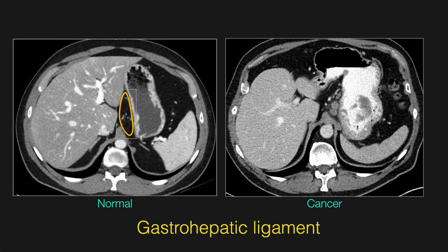When you're concerned about gastric adenocarcinoma, often you don't have to look much farther than the gastrohepatic ligament for clues. Normally, there is just fat between the lesser gastric curvature and liver edge. And remember, you cannot distinguish normal ligaments from fat on CT. You can only distinguish them when they become diseased. It's important to get comfortable with this location and recognize it as one of the first places that bad lymph nodes and thickening end up for gastroesophageal junction and gastric adenocarcinoma.